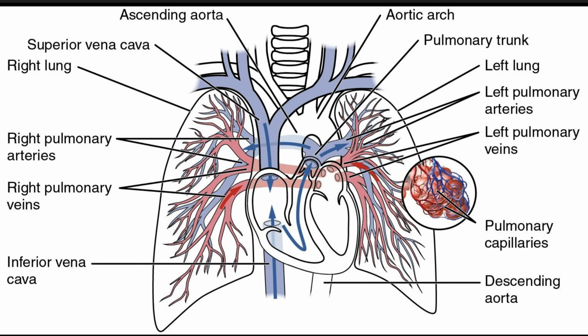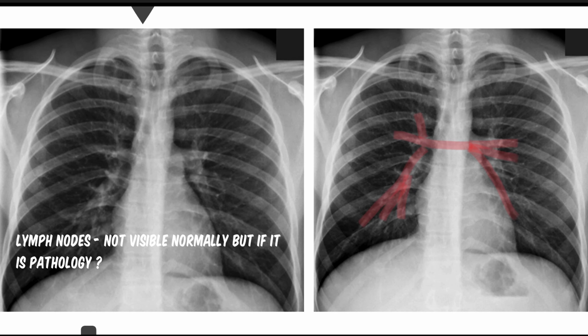Same with the left. So on this screen, let's first find the trachea, i.e. the lucent black thing that's going down near the spinous process. Now you can see it's splitting left and right. You've got your right main bronchus giving off a branch. Here we don't exactly know whether this is a bronchus or the pulmonary artery. So usually when it goes in here, this whole white thing.